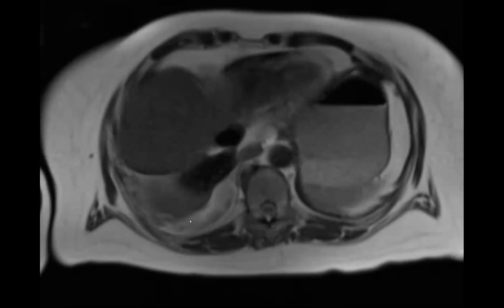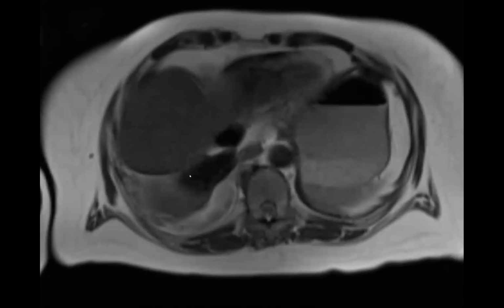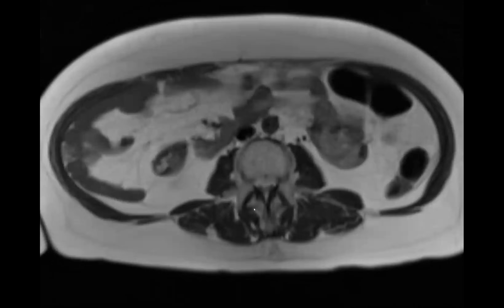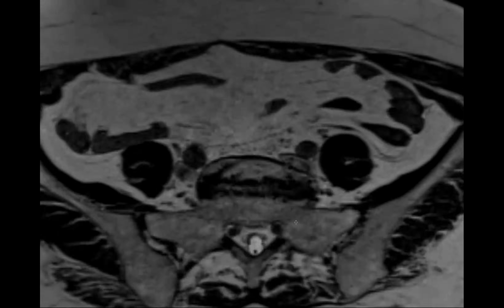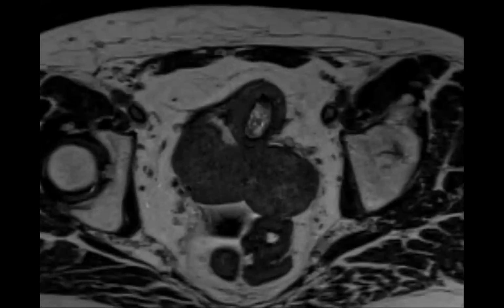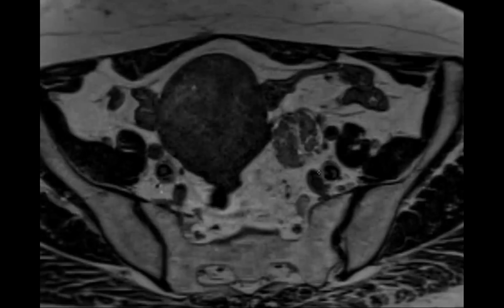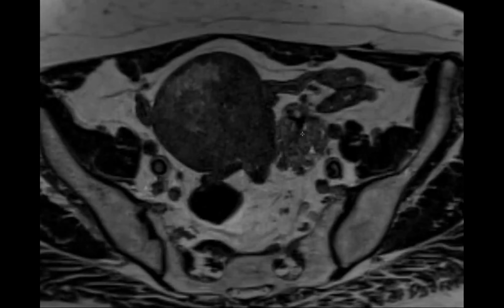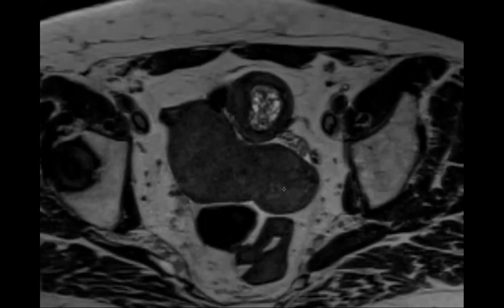I'm showing you one more thing. Oh, Meigs syndrome. It's a Meigs syndrome. It's a torsed fibroma. Finally, I got something right. Okay, let me show you. So this is basically the fallopian tube and vessels that are torsed. These are all actually engorged vessels. And this is the devascularized fibroma.